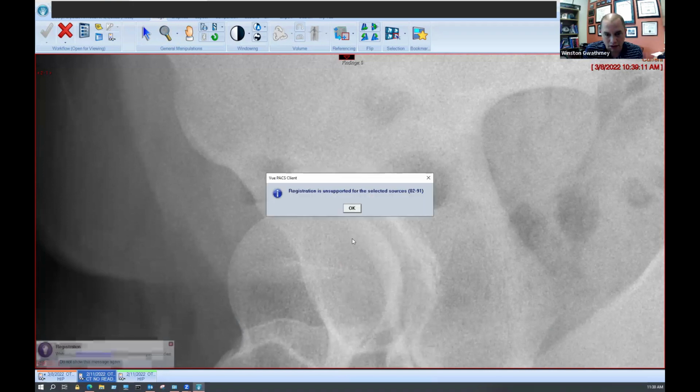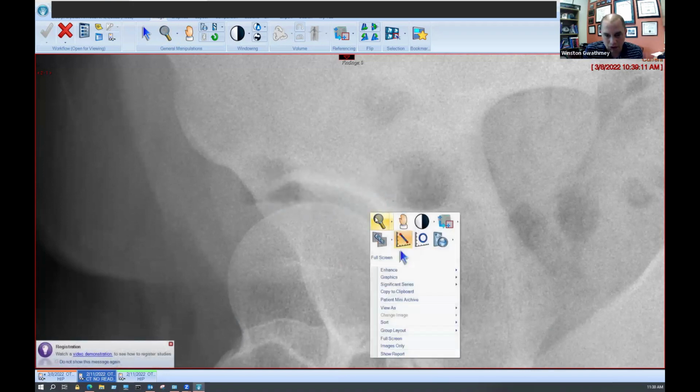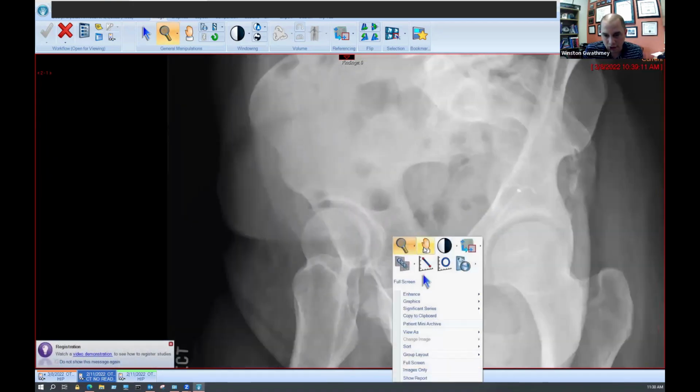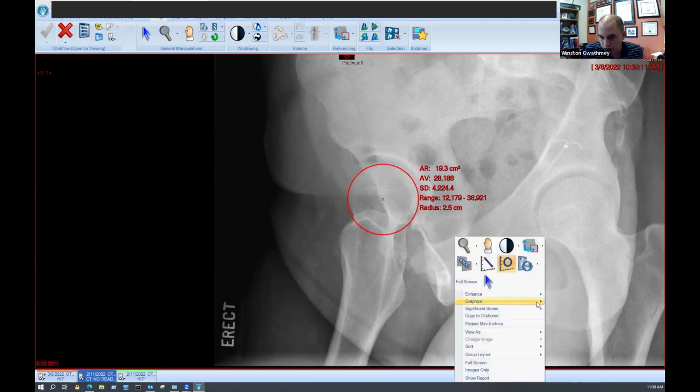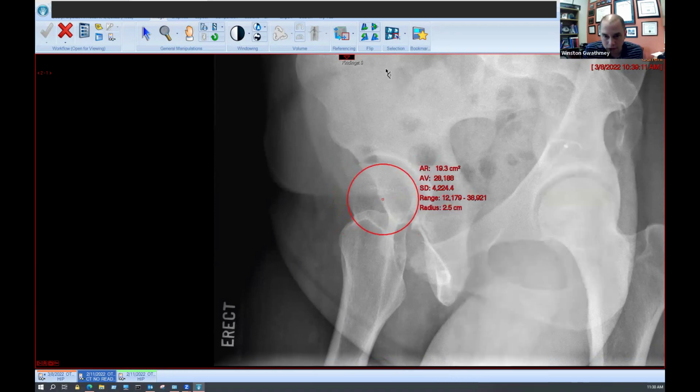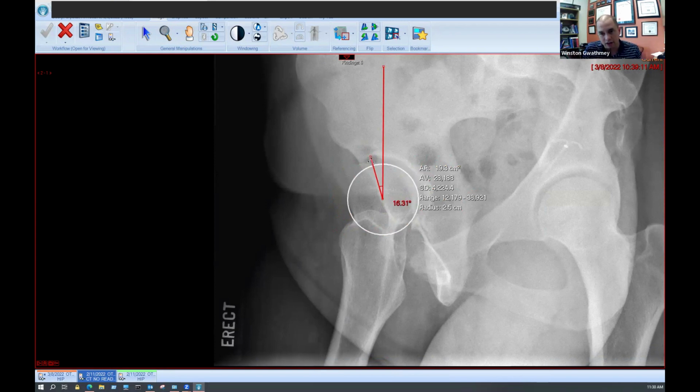Again, if you zoom back out and look at the false profile on this one, completely different look than that last. You can see just how much that femoral head's uncovered in the front here, you can put our little angle coming up from vertical straight down to this line here, and you can kind of get a sense the sourcil still kind of peters out right around here somewhere. So her weight bearing dome, I mean, she's probably somewhere in the 15-degree range anterior center edge angle. Let's get that perfect so we can make sure, maybe 16, even though you could probably argue that her sourcil kind of ends right around here.